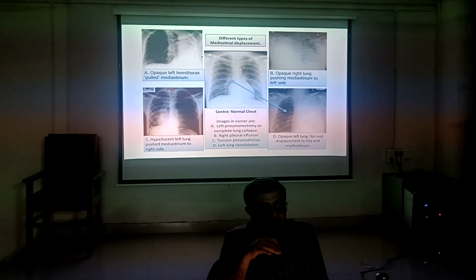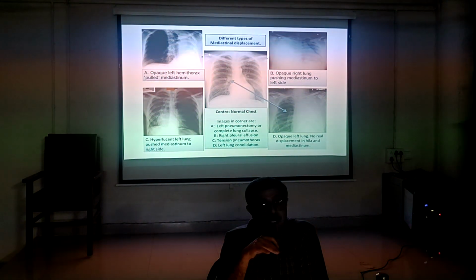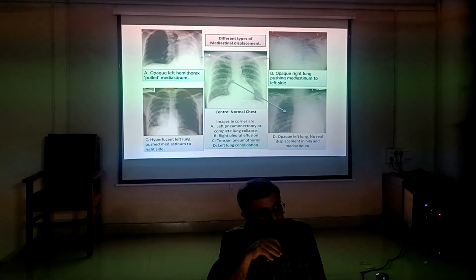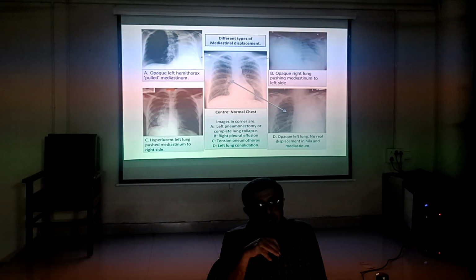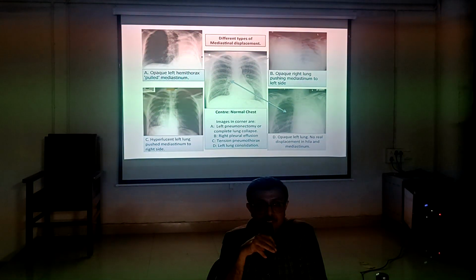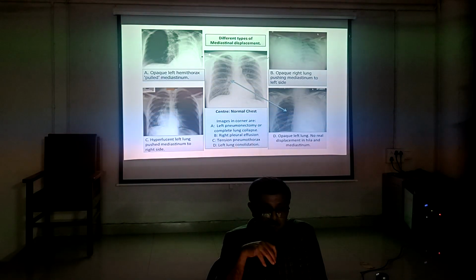Hemi-opaque lung, ARDS, complete whiteout lung. Parenchymal loss હશે તો pull કરશે, fluid હશે તો push કરશે. બરાબર? સમજાઈ ગયું? Now lucency, radiolucency, black lung, black hemithorax.